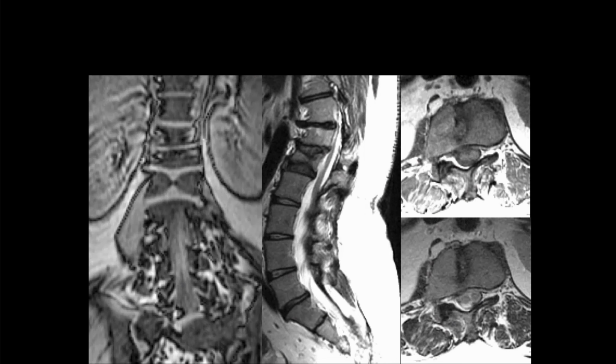Okay, Tayson. All right, so definitely it looks like we have some collapse of that vertebral body there. L1 looks a little bit odd here in the coronal. Yeah, it kind of looks like an incomplete cleft there on the axial. On the scout view here, we can see a cleft in the middle here. So again, this has a sagittal cleft.